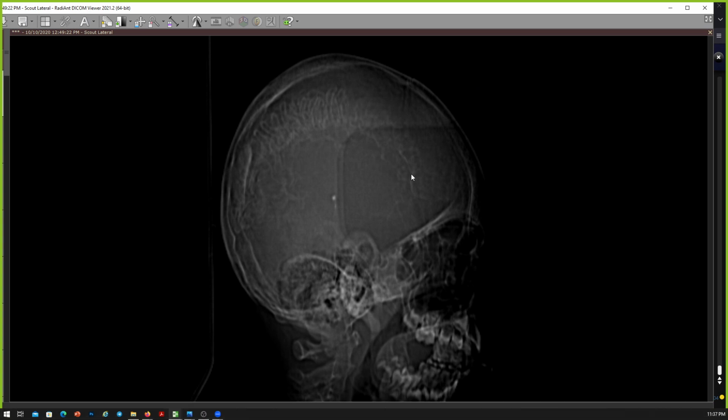They are taking the shape of... Which ones? The cortical. Are you speaking about these? Sorry. Yes, yeah, you can go ahead. I can see calvarial thickening in addition to multiple curvilinear calcifications taking the shape of the cortical gyri in a young patient.